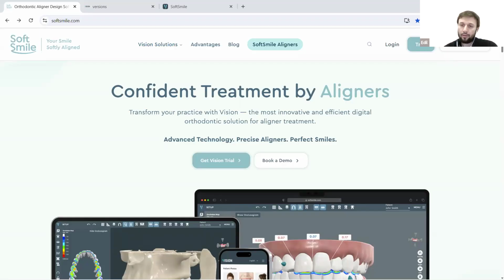So the advanced with blockouts basically tries to smoothen all the undercuts and the black triangles. The other one will export models as is. So that's the main difference between the two. And I think we'll be getting rid of the default option, just not to confuse the users too much. So advanced and advanced with blockouts are the ones that will stay in the software in the upcoming releases.